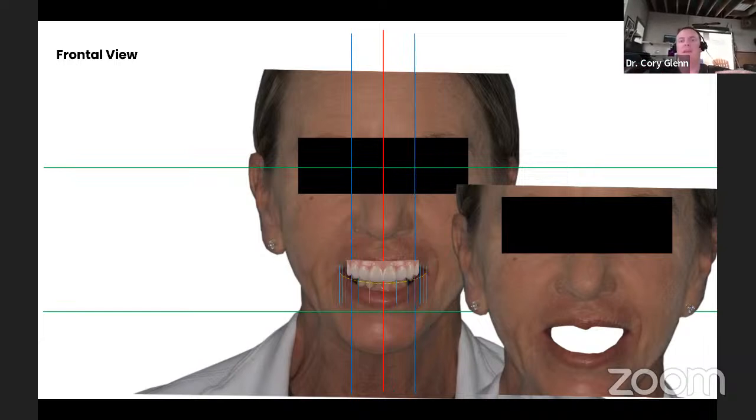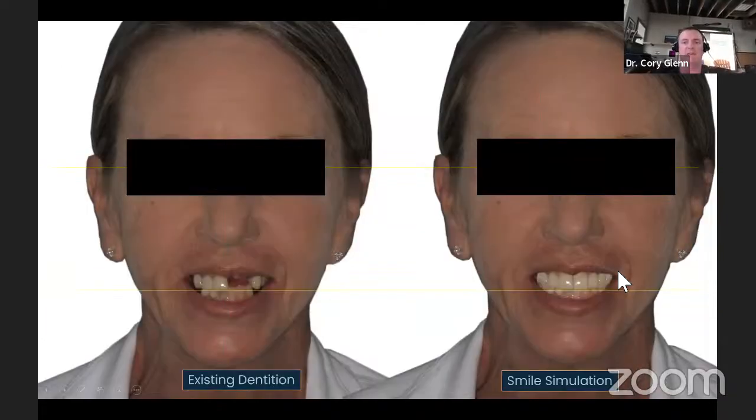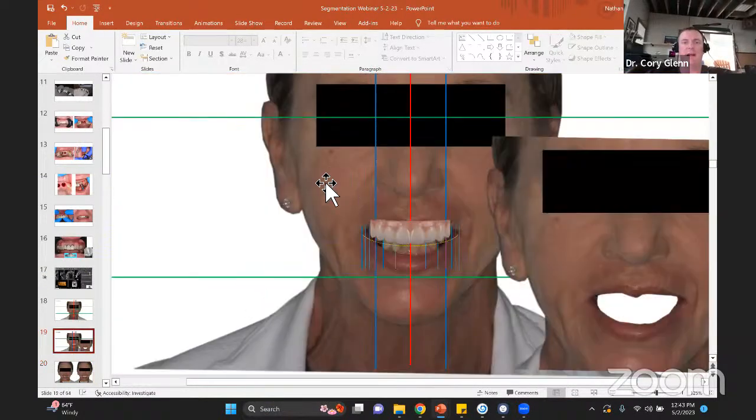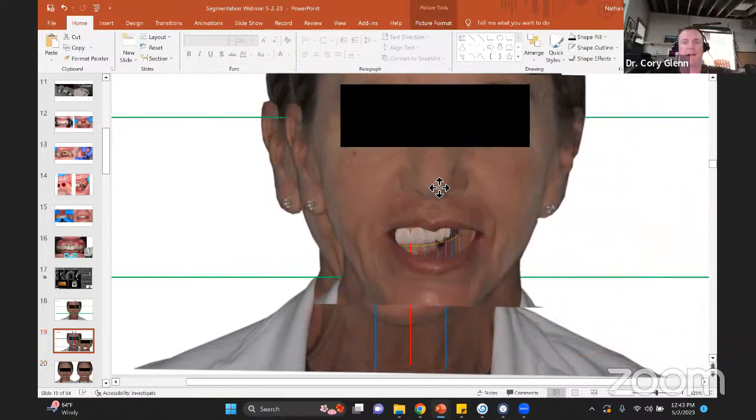So one thing that you cannot do in PowerPoint is you cannot create a PNG file that allows you to basically cut out what's in between the lips. So a lot of times, if I want to kind of do a hybrid workflow, I'll take this facial picture into GIMP and I'll just cut the mouth out, okay? And then save it. And now this is going to be the exact same image as the image right here. It's just got the mouth cut out.